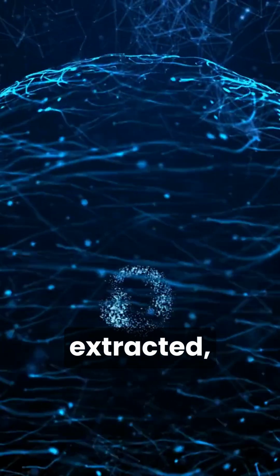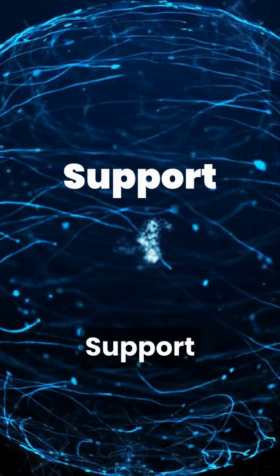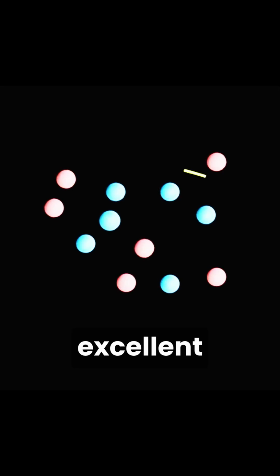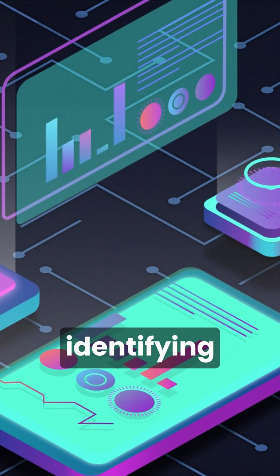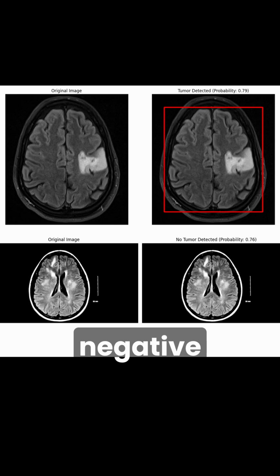With our features extracted, we move to the machine learning phase. We use a support vector machine, or SVM, from the scikit-learn library. SVMs are excellent for classification tasks like ours. We split our data into training and testing sets. The SVM learns from the training data, identifying patterns that distinguish tumor-positive scans from tumor-negative ones.